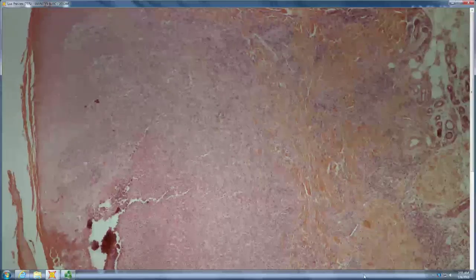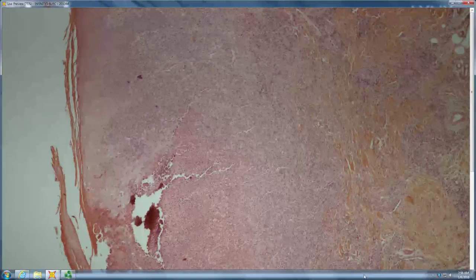Yeah, chancre tends to have a lot more granulation tissue and be broader, and is more likely to be mucosa. I see. This has a bundled dermis like skin and lots of adnexal structures. But something suppurative with some granuloma surrounding it, so forming kind of a stellate abscess.